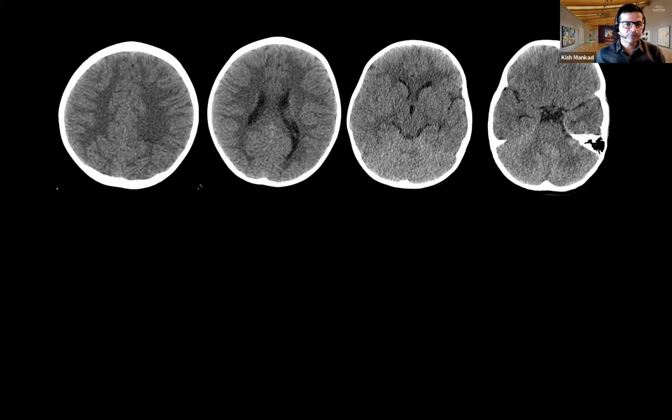And this is going back to very basic anatomy. We like keeping it basic on this platform. To start with, this was your initiation into CT today. You've got the left and the right cerebral hemisphere, the white matter appearing dark, the cortex appearing dense, and that's because it has a lot of packed cell neurons. So the density on CT scan will be relatively high compared to the white matter, and the density of CSF will be even lower compared to the white matter. So 3 shades of gray, if you think about it.